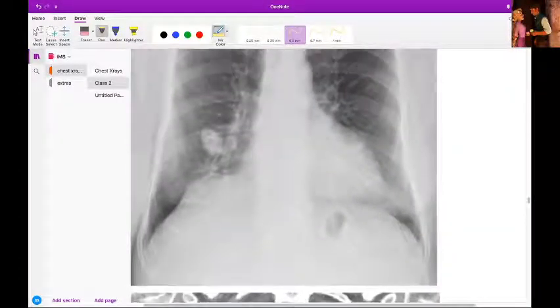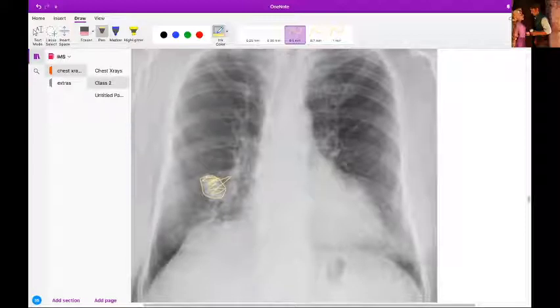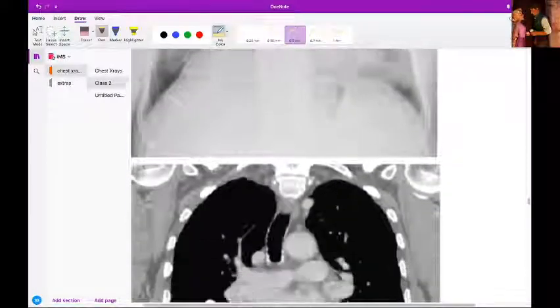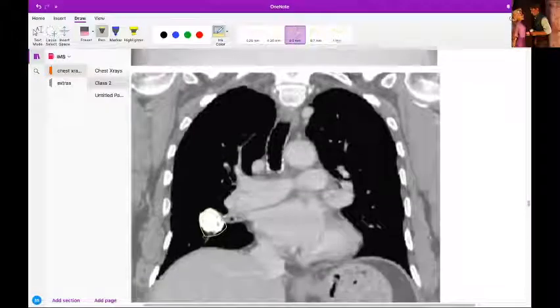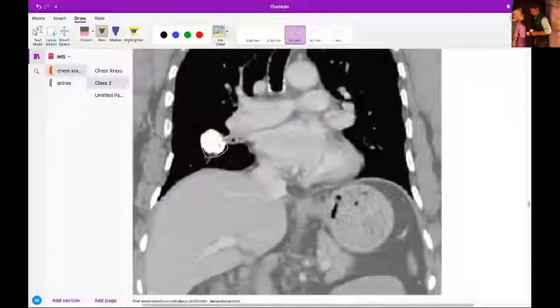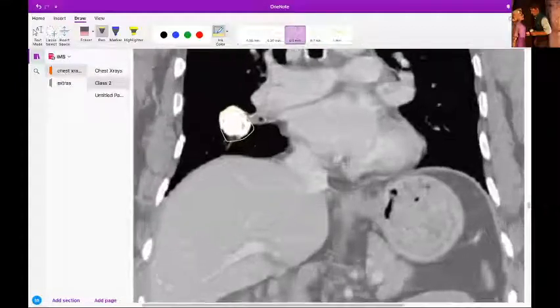Okay, so now this nodule over here. It's very well defined and very opaque because it is densely calcified. Right lower. This dense calcification mostly points to a benign etiology. In the same X-ray and CT scan, you can see how calcified it is. So this is basically a hamartoma. If it's densely calcified, it's less likely to be malignant. It's more likely to be benign.